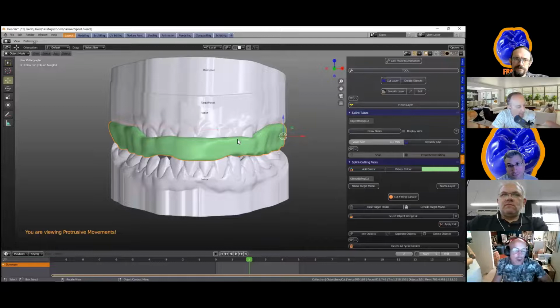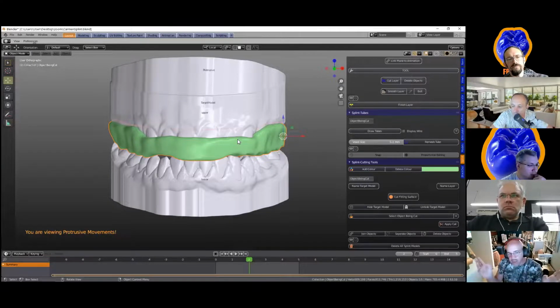Although in the components module, we've got the fail-safe mask add-on, which will then preserve the inside of this mesh. And I would like to, in the near future, include that as well, so that after you cut out the inside surface, we can still sculpt on it and do whatever we want on it and it won't affect the inside surface. So that's going to be my next mission down the line.